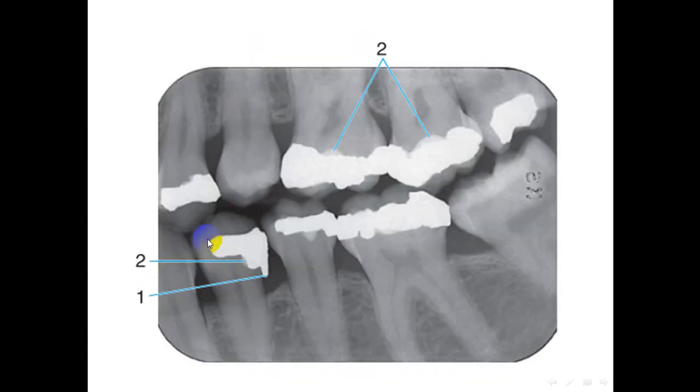second radiograph, which is a bite-wing radiograph, shows an amalgam overhang, and this is the overhang due to a mistake from the dentist who did not make proper wedge placement in a retainer.